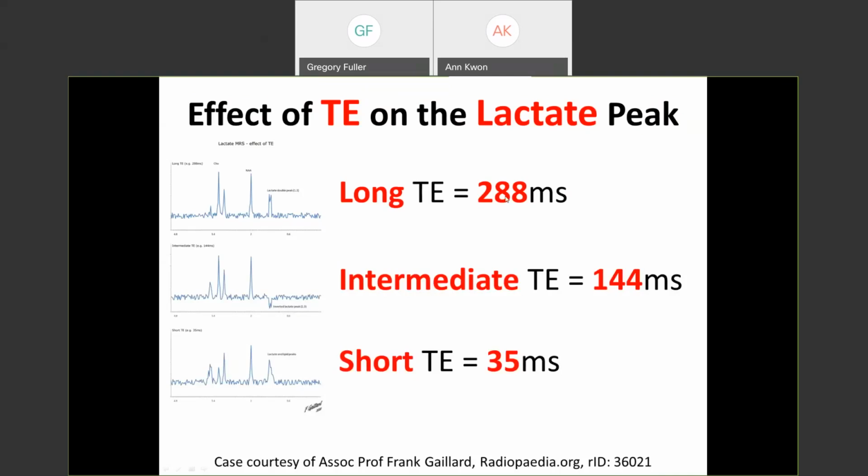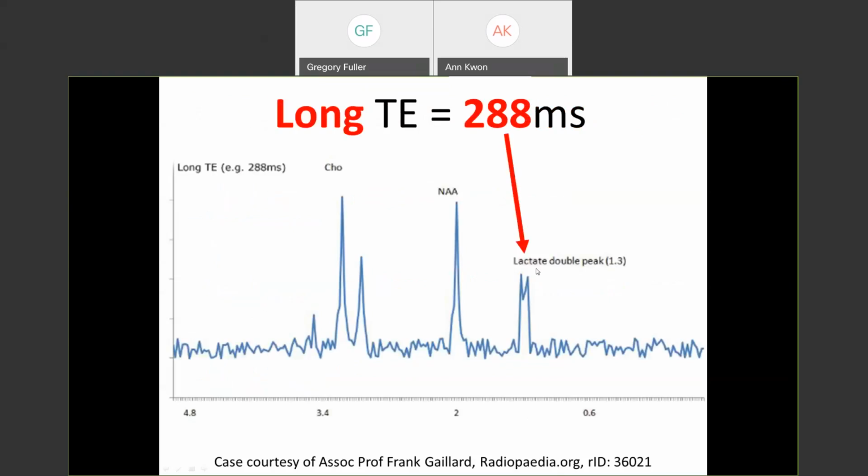So long TE, we'll call it 288 milliseconds, intermediate 144, and short 35 milliseconds. I'm giving full credit from Radiopaedia here to Dr. Gaillard. Here we go. Long TE, here's the typical upward going lactate double peak. So you see the double peak?